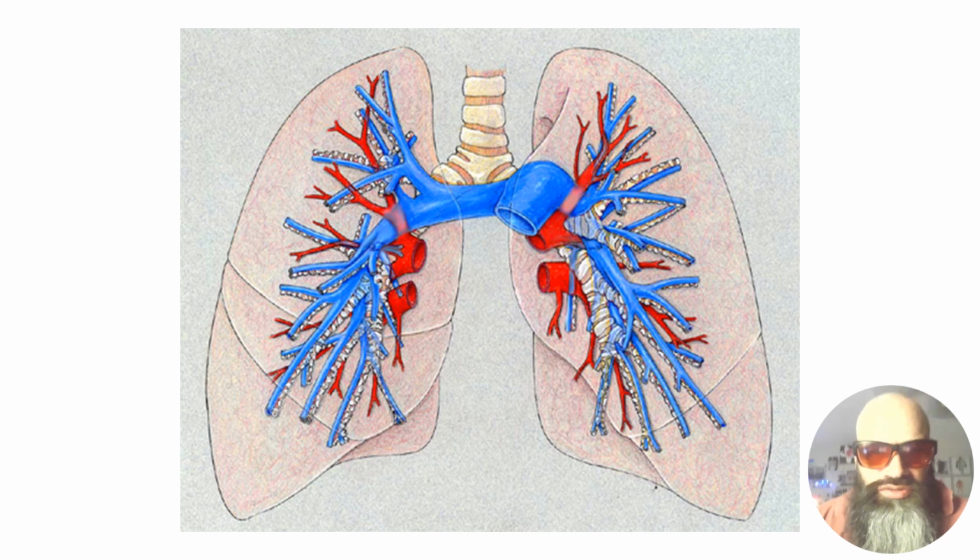Normally, this is what your lung and bronchi should look like. On x-ray, this should be invisible, particularly the bronchi. Now, on a normal chest x-ray in particular, you will see some of the hilar vascularity, such as the pulmonary arteries and vessels around the perihilar region. But for the most part, the majority of the bronchi should be invisible in a normal, healthy lung.